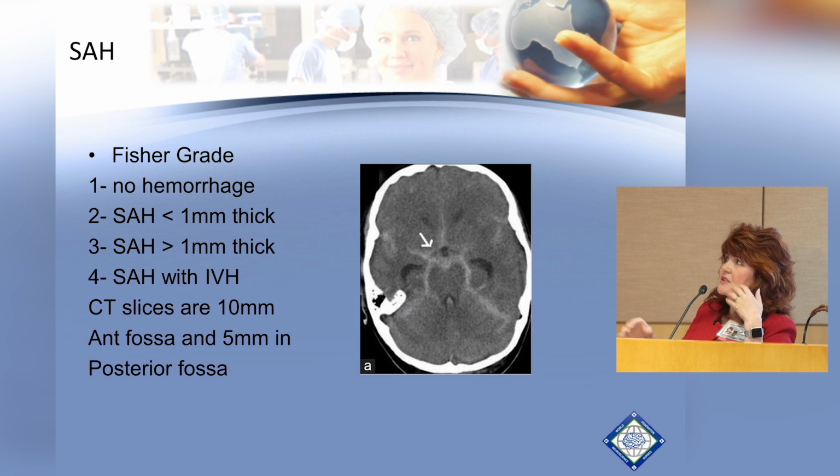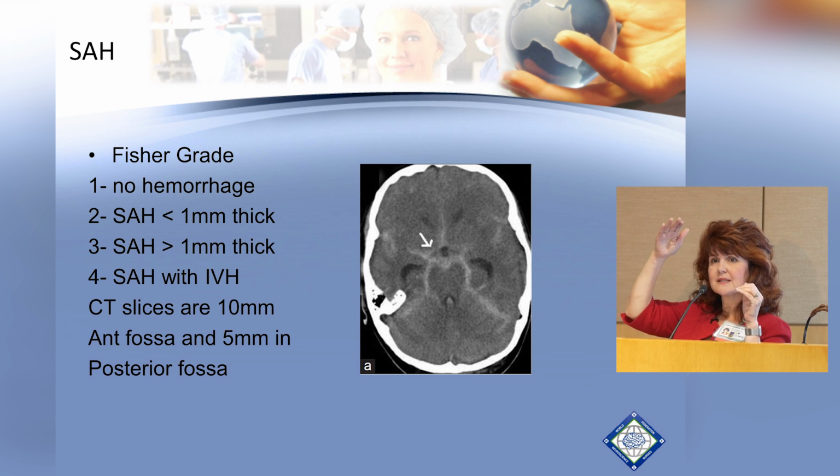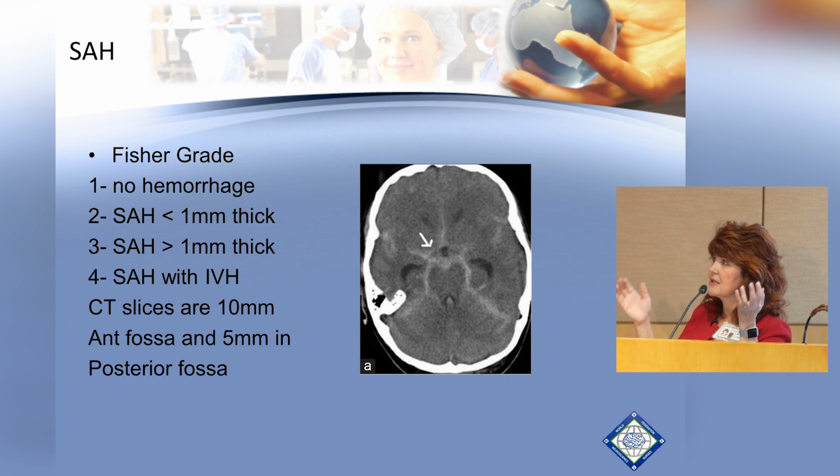So I just want to talk about the imaging findings associated with subarachnoid hemorrhage. Again, it looks kind of like a star shape or a starburst and somewhat marbly in the brain, because all those little black spaces fill in with blood where the CSF fluid would normally run.